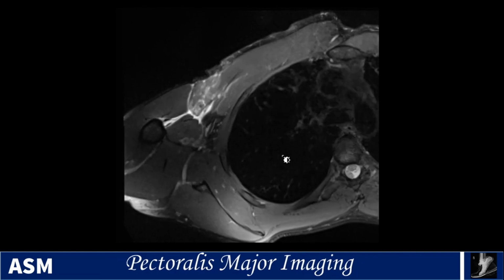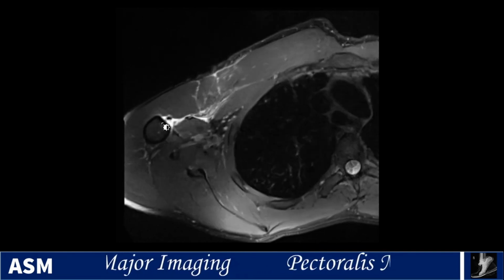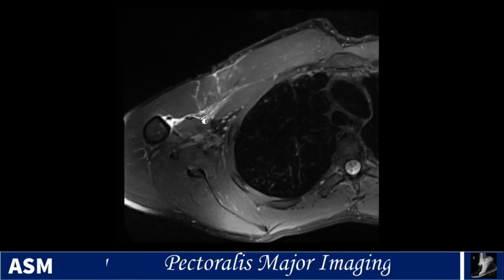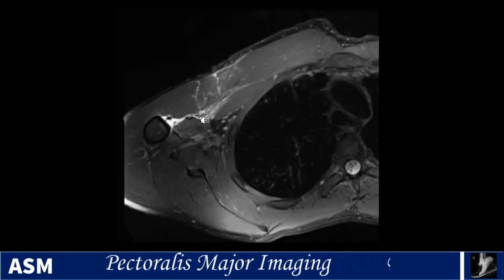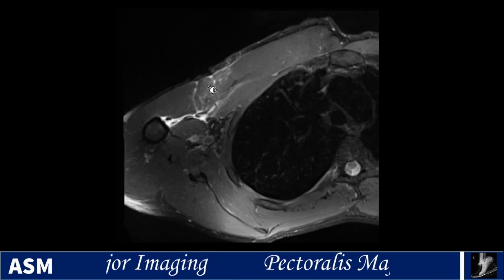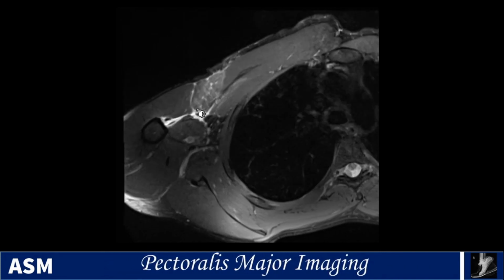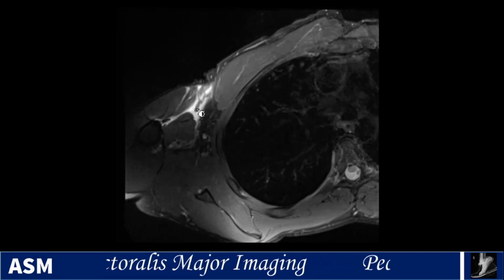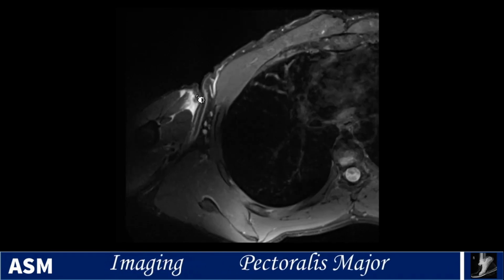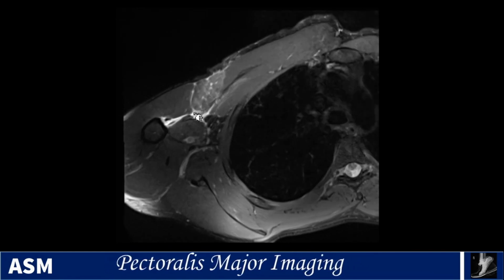And now just to show some of the higher grade injuries, this is a complete avulsion from the humeral attachment, and you don't see any of the tendon coming down in this case. You do see retracted, sort of redundant tendon back here. It's retracted back to the myotendinous junction. There's feathery edema in the muscle back here. We can see some hematoma here, and so this often shows up clinically, by the way. When you see these patients acutely, there will often be ecchymoses and bruising in this region here, and sometimes you can actually feel a palpable cord where that tendon stump is.